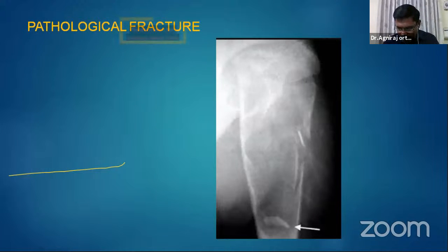So now I will call Vishal. Vishal, can you read this X-ray and say the diagnosis? Good evening, sir. Good evening. Sir, this is an X-ray. So I'll give the points. All the 7 points you should follow. All the 7 points you should say.